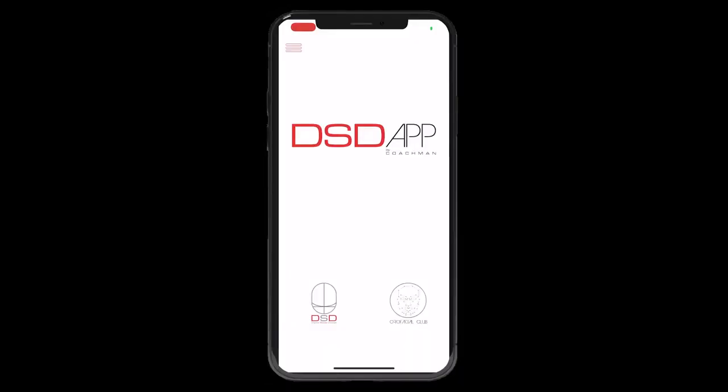Now, let me walk you through the simple process of customizing your AI smile simulation so you can get the best design for your patient. Taking the perfect picture. To begin the smile simulation, tap the menu on the top left corner of your screen.